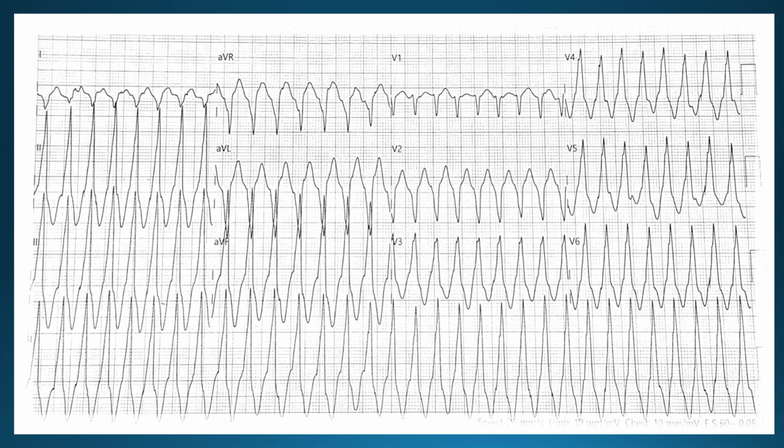The first question that arises when we are labeling a tachycardia as a broad complex tachycardia is the QRS width. Now, the QRS width of this tachycardia was 140 milliseconds. For a normal QRS, it has to be 110 or 120 milliseconds. So it's a bit higher width as compared to the normal. That's what categorizes it to be a broad QRS.